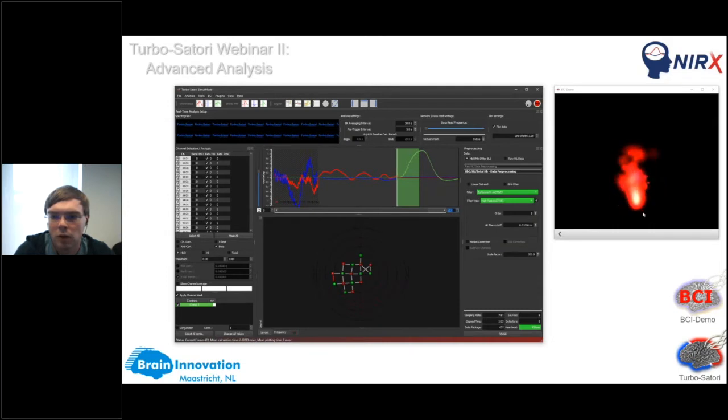You can basically look at the flame and should be able to see that this signal is directly coupled to the signal over here. So you see the increase here, and basically the flame is also increasing in the same manner.